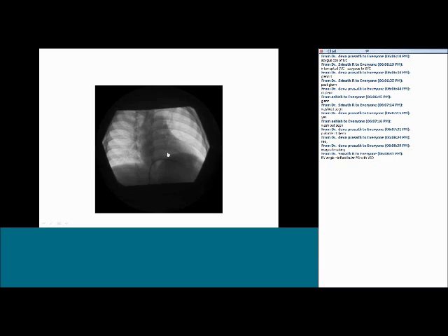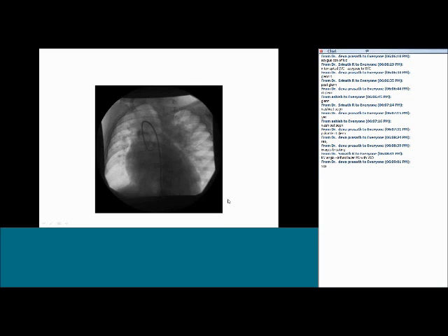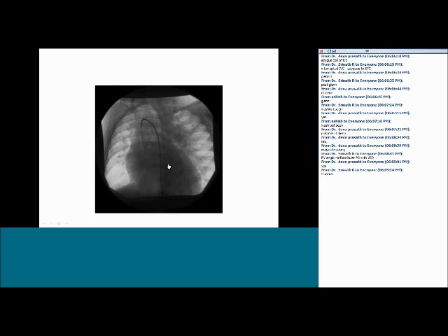Okay. Is the image clear now? I'm sure it is clear. Okay, for the next one. This is a pigtail catheter in the ascending aorta. You need to tell me the diagnosis. Quick hands on the keypad, please. Yes, correct diagnosis. Srinath, correct. It's a truncus arteriosus.